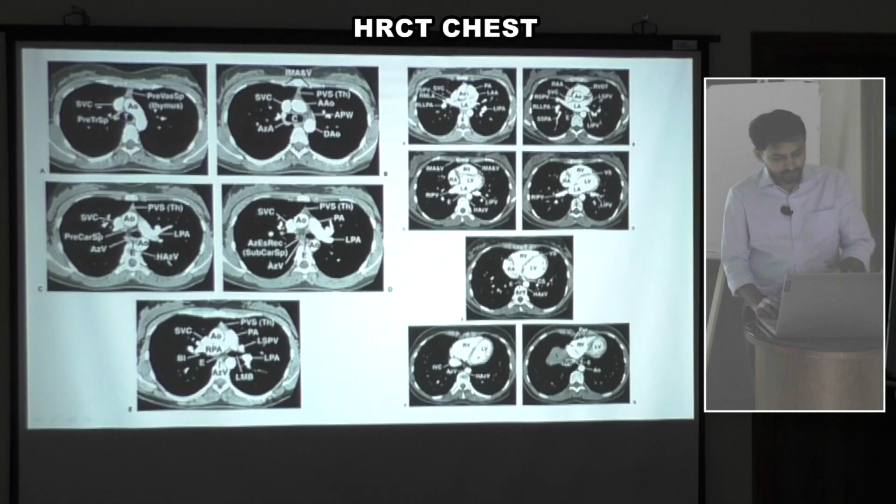you see only ventricles, and then the IVC drains into the right atrium. So this is the right ventricle, and almost at the end of the heart sections, then upper abdominal structures will start to come. So this is the liver portion. So majorly pulmonary arteries. This is the right pulmonary artery, this is the left pulmonary artery, this is the main pulmonary artery.